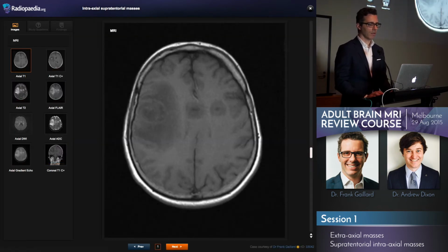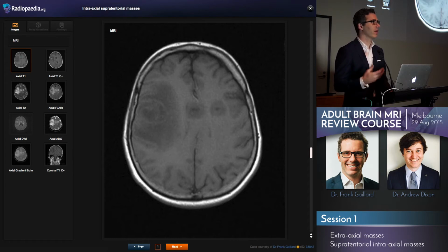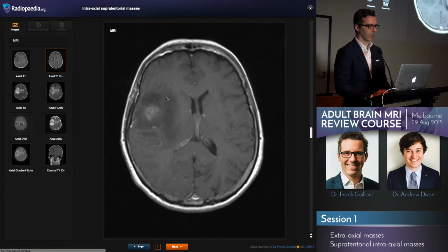Metastases we see a lot of, especially as patients are surviving their systemic therapy more and more. And then sometimes we see them overrepresented because a systemic therapy doesn't get past the blood-brain barrier and therefore the brain acts as a reservoir of disease. It's particularly the case with HER2-positive breast cancer where we see brain recurrences really frequently. And I put this case up here, and this was one of the quiz cases that we put, not because it's metastases, but because it's very tempting to call it metastases because you have 3 enhancing lesions.